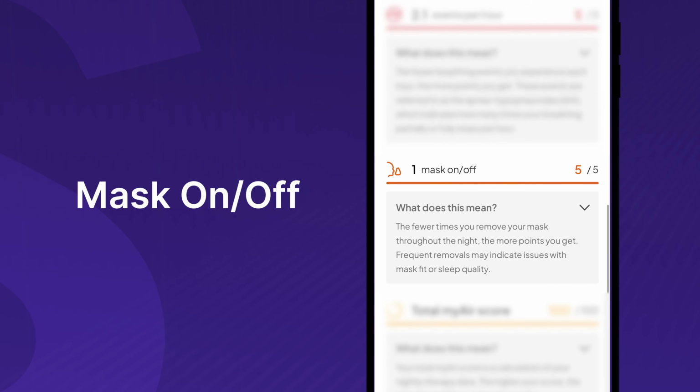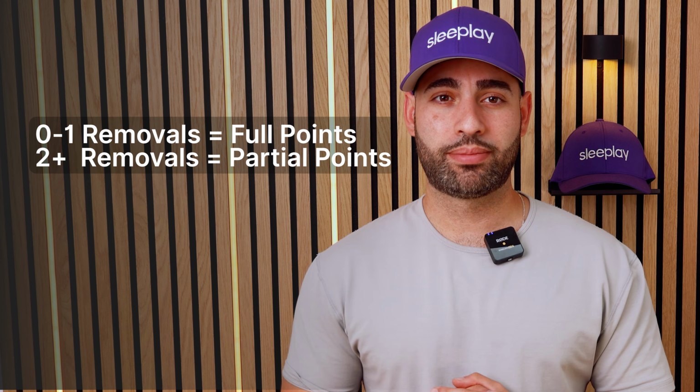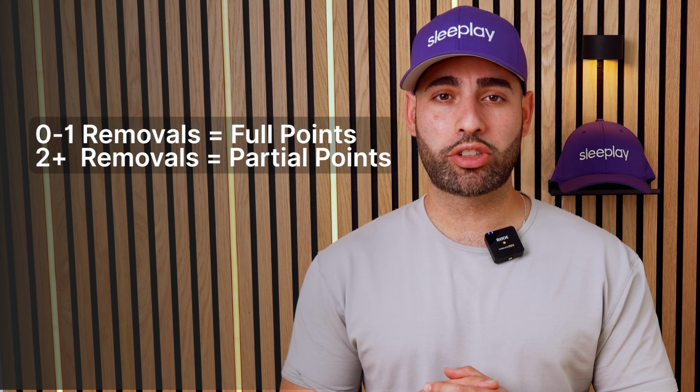Mask on, off count. Did you take your mask off multiple times last night? 0 to 1 removals equals full points. 2+ removals equals partial or no points. Constantly removing the mask might mean discomfort, dryness, or wrong fit. All things that the myAir app can help you fix.